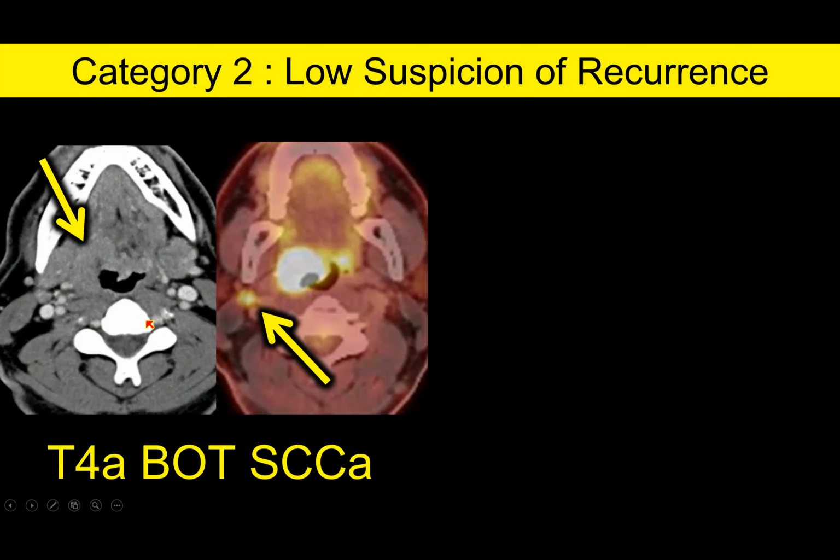but this is certainly a big issue these days with oropharyngeal HPV positive squames, which have really changed the way we think about squamous cell carcinoma, certainly than when I started 30 years ago. So we have a definite cancer here that's high density wrapping around the sulcus. We see a lot of increased uptake and we see nodes.